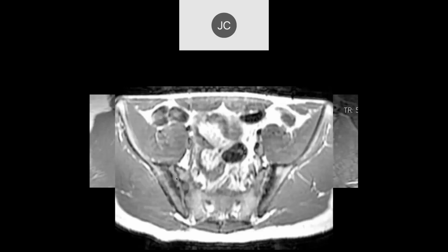You like to pick up sacroiliitis before you get these erosive changes. And then a lot of eburnation here as well. So this is actually a pretty chronic, long-standing disease, and this was an ankylosing spondylitis. We would like to pick it up long before it gets this severe.